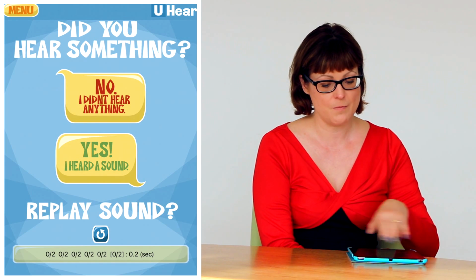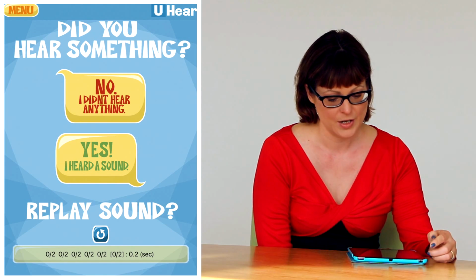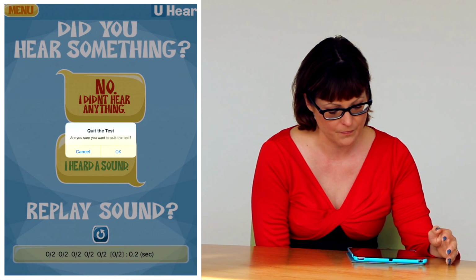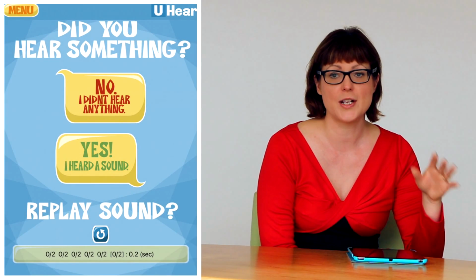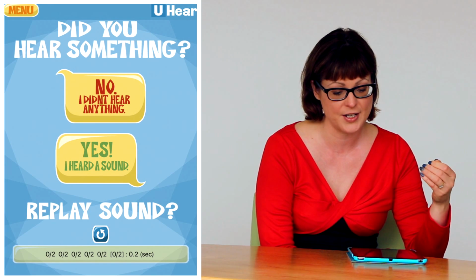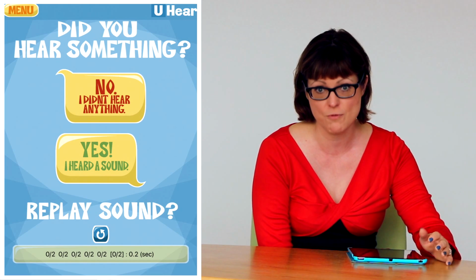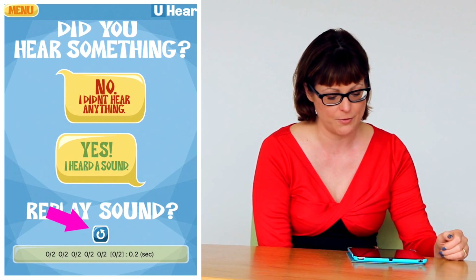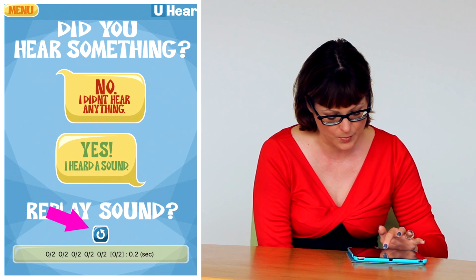So here we are on the testing page, and it doesn't really vary. So in the top left hand corner we've got menu. If we tap on that it allows us to quit the hearing test. You do need to be in a quiet background, so if someone pops in and interrupts the test or the background starts getting really noisy, you've got a couple of options. So you can press menu and quit out of it, or there's this button here to replay the sound, and that is in the middle of the screen. I'll just tap it now.